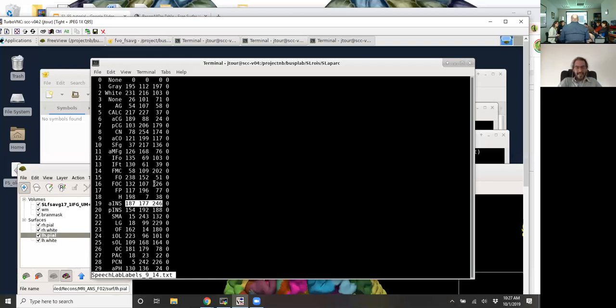It would be a shame to think about the way FreeSurfer does this, understanding how FreeSurfer does this, and allowing that to erase what is probably the exact right intuition about how these color tables work from just about any other brain image display software.